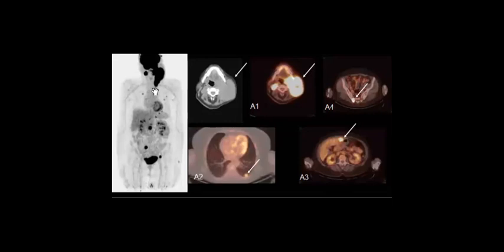I agree that when you find this lesion, it could also be from the mouth floor, maybe. And there is lymphadenopathy. So you agree with me that there is lymphadenopathy, right? Left neck mass, contralateral lymph nodes, which look like high uptake, and you can see here.